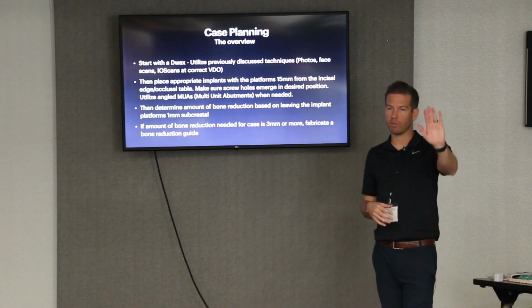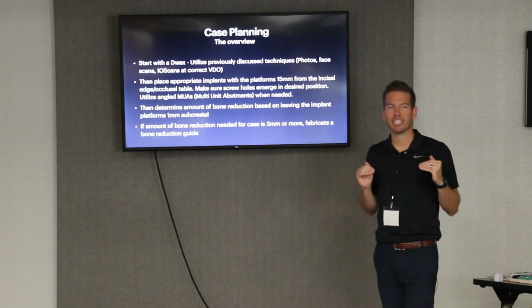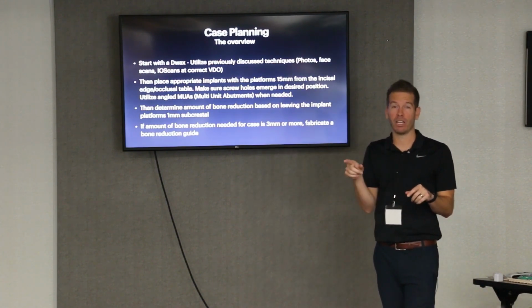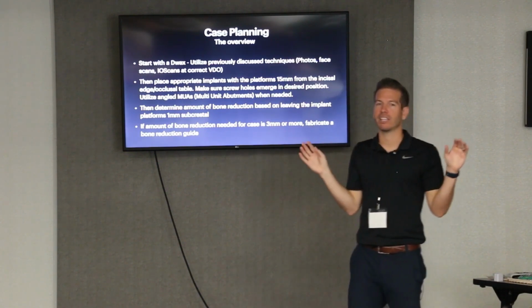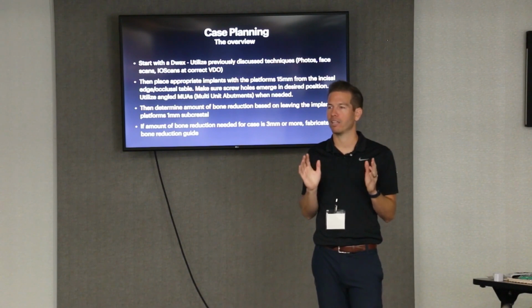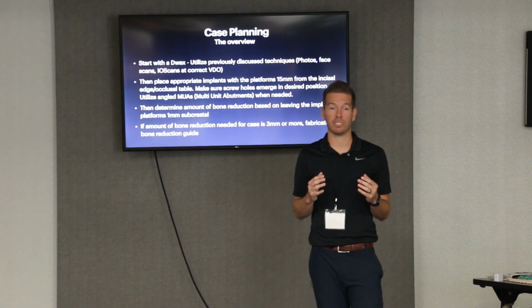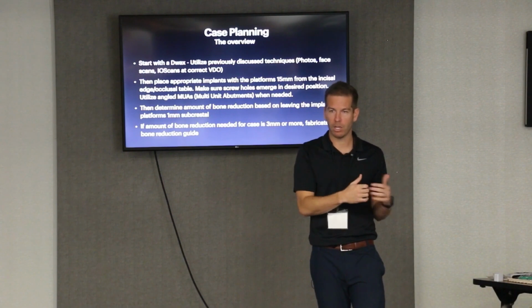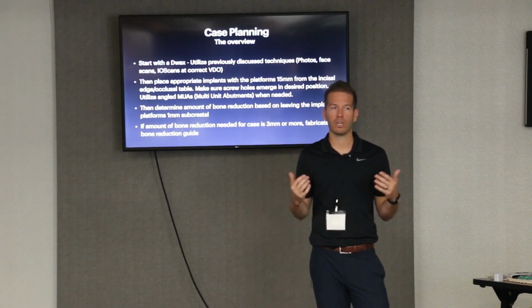You start with the case. You have the patient's photos up on your screen, and then you're opening up the case, and avoid that temptation to start grabbing implants and dragging implants into the bone. Like, stop, postpone. Put the teeth in there first, and say, okay, where do I want this final restoration to be? And then you'll get an idea of, whoa, geez, my teeth are impinging right on the bone. Like, I'm gonna have to get that bone out of the way. Or, man, where the teeth are, there's just really no bone there.